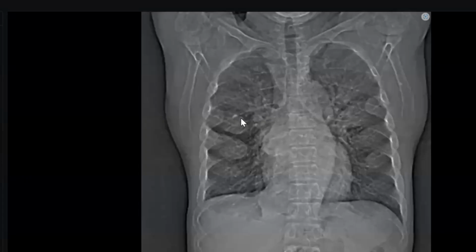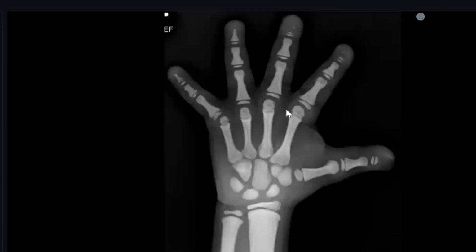What happened here, my colleagues? Expansion of all the bones, especially the anterior part of the ribs, associated with osteopenia. If you look here, at least you can see paravertebral soft tissue. So it is a hemolytic anemia. Why is this not sickle cell? Sickle cell causes infarction. You should see H shape vertebrae here. Thank you, doctor. Next candidate.